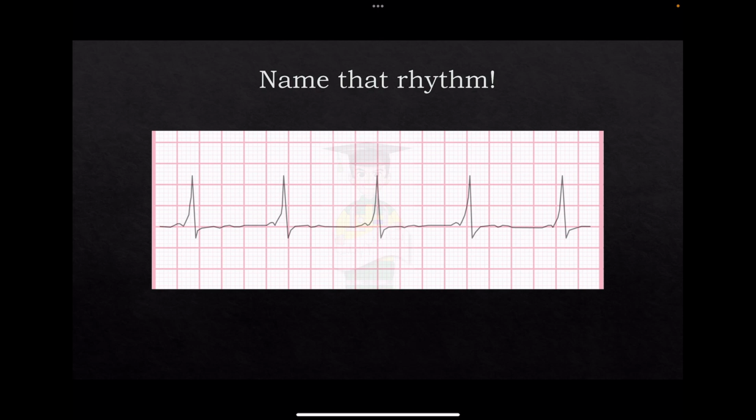Okay, what's this one? It jumps out at you. That's why the more you look at EKGs, I gave all those resources and modules in your Canvas shell. You have to keep looking at these things. They'll point out at you. Look for rhythm, look for symmetry, patterns. That's how you can see things popping out very easily, looking for patterns. Yes, all that right there. There's your delta wave. This is Wolff-Parkinson-White.